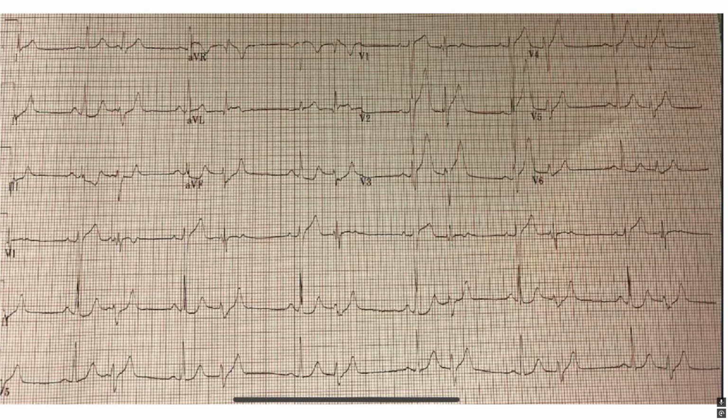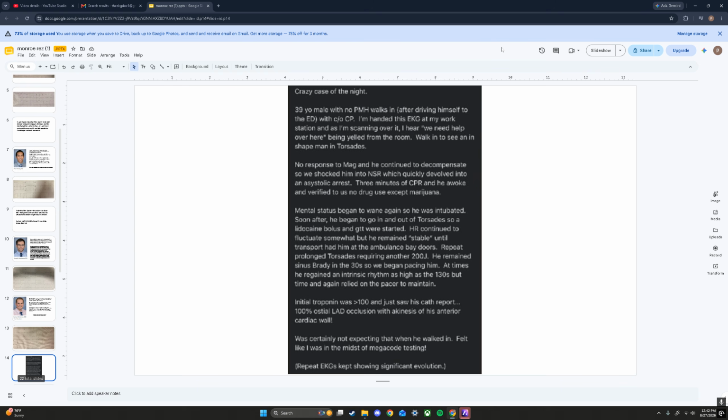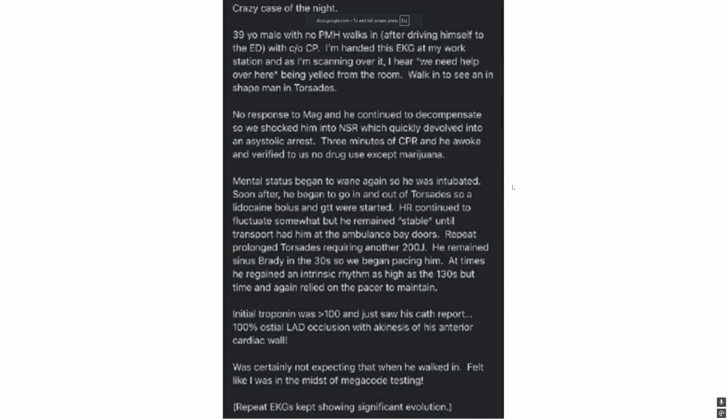Okay, so overall, this qualifies for an infarct, and there's many other things on here which are concerning. You know, the V1 bigger than V6, all those other things. So this is a STEMI, okay? But let's see what happens with the case. So this is the case, okay?